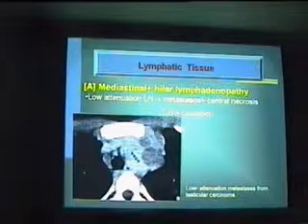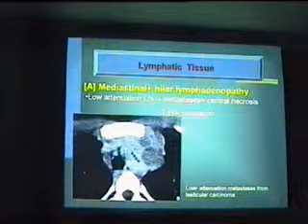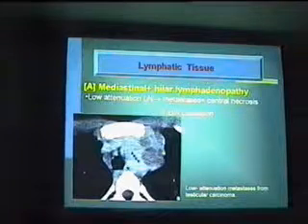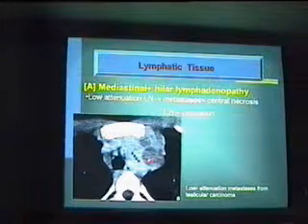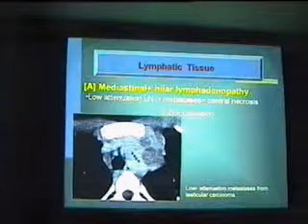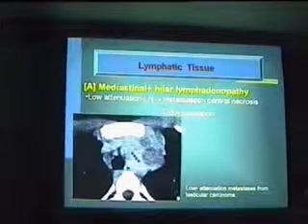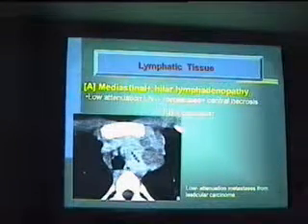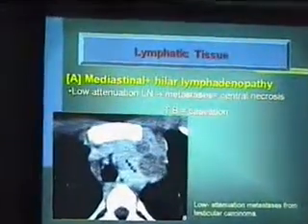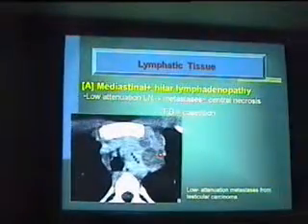ولو نزلت تحت شوية الاقيها في الاورتيك ويندو في الاورتوبالمونري ويندو. فممكن التشخيص هنا يبقى باللوكيشن والابييرنس together. that's most likely lymph nodes. قلنا البريكنج داون ممكن يبقى نيكروسس وممكن يعني في ميتاستاتيك نود او ممكن يبقى كازيشن لو انا في تي بي، وهشخص بالاذر سبستانشال ايفيدنس. ما عنديش كالسيفيكيشن elsewhere في الليمف نودز، ما عنديش افكشن لللنج في صورة تي بي، يبقى الحالة دي الحقيقة جاية من ميتاسيس من التستيكولار كارسينوم.